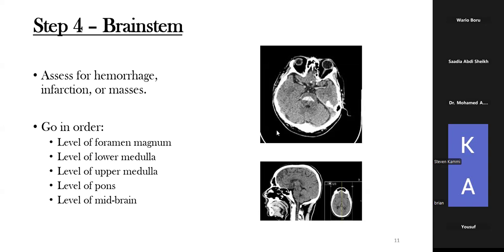How do you tell brain contusion on CT? Good question. So on CT, you'd see there's just an area with a small hyperdensity. The way I normally think of it is that a contusion is a small intraparenchymal hemorrhage. They can be multiple or it can be single. So that is what I would say is a brain contusion.